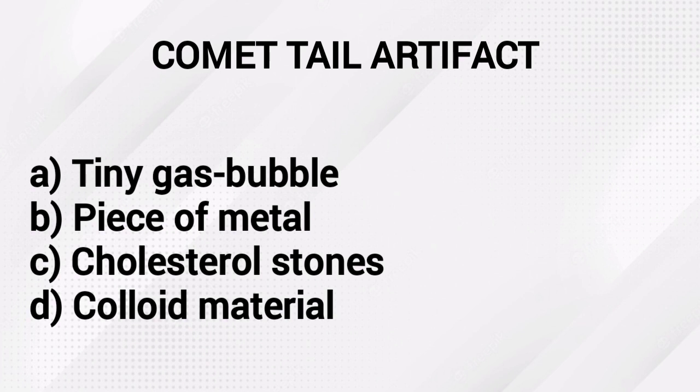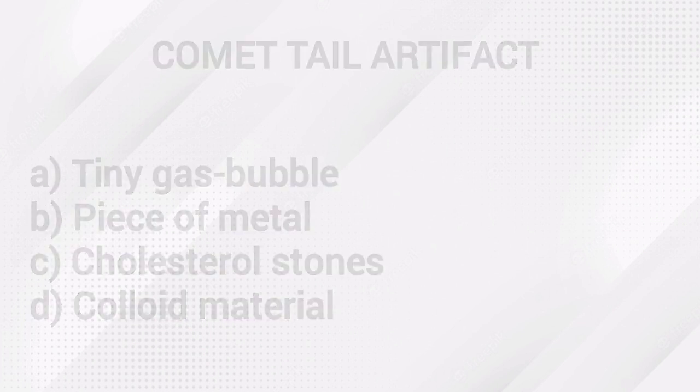Some pigment cholesterol stones, usually in the wall of the gallbladder, will produce comet tail artifact, or colloid material in the thyroid nodule.